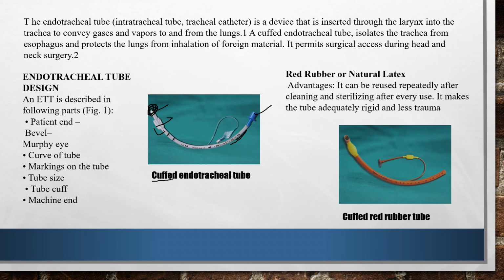And this one is our red rubber catheter. The major advantage of this red rubber catheter is that we can use it repeatedly, and it causes less trauma to the patient.